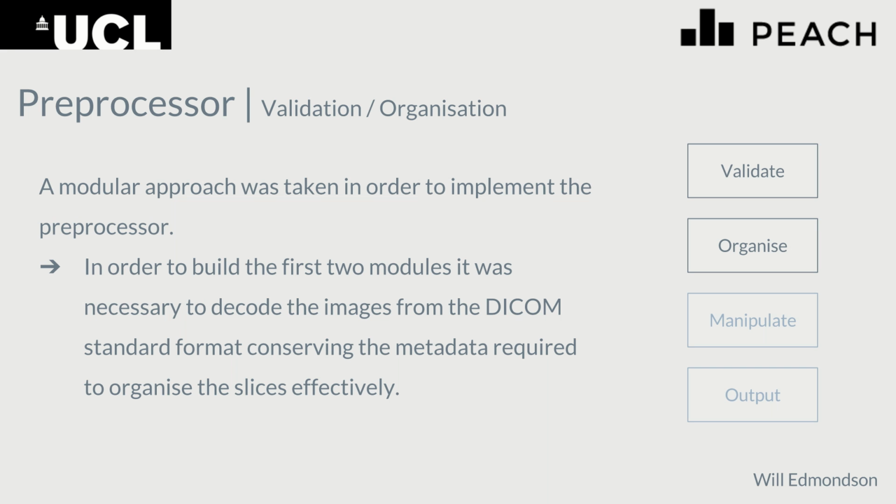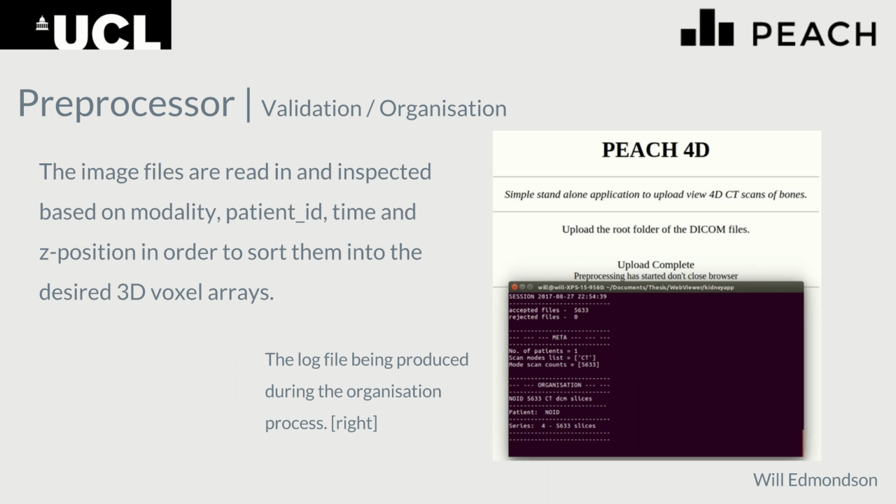In order to build the first two modules, it was necessary to decode the images from DICOM standard format, conserving the metadata required to organize the slices effectively. This is shown here on the right. The images are read in and inspected based on the modality, patient ID, time, and the Z position of each slice.